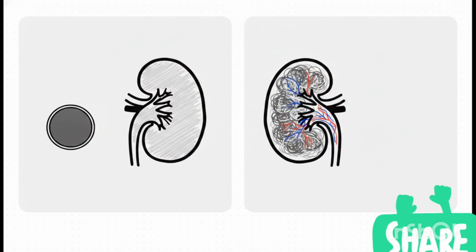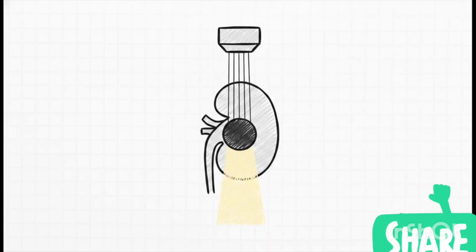But then contrast that with a renal mass. This is a much more complex structure. It can appear solid, heterogeneous, meaning it's mixed in texture, or sometimes cystic. Crucially, if you use color Doppler on a mass, you'll often see internal vascularity, meaning blood is actively flowing inside of it. Because of this complexity, any suspicious renal mass always requires further assessment with a CT or MRI scan for accurate characterization.